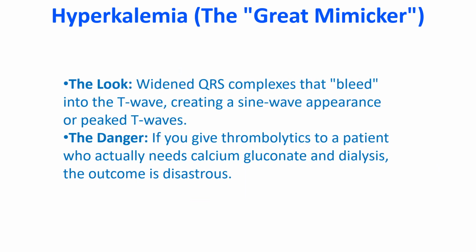Never forget the metabolic mimics. Potassium shifts can cause pseudo-injury patterns: widened QRS complexes that bleed into the T wave, creating a sine wave appearance or peaked T waves. If you give thrombolytics to a patient who actually needs calcium gluconate and dialysis, the outcome is disastrous.